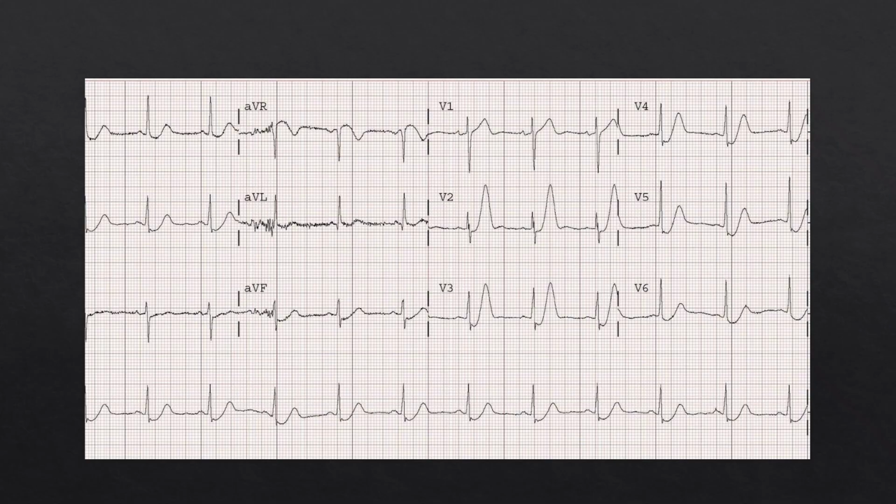And one final example here just to drive it home. Another ECG case: we look at it, and we see tall symmetric T waves in the anterolateral region with corresponding ST depression. So another example of those De Winter T waves in a real ECG case.